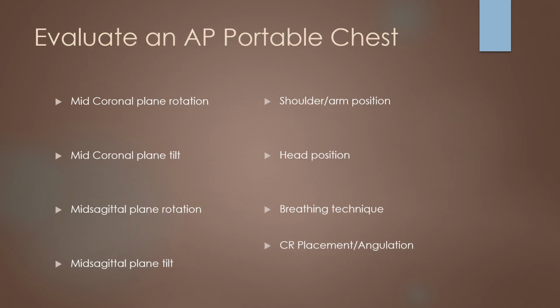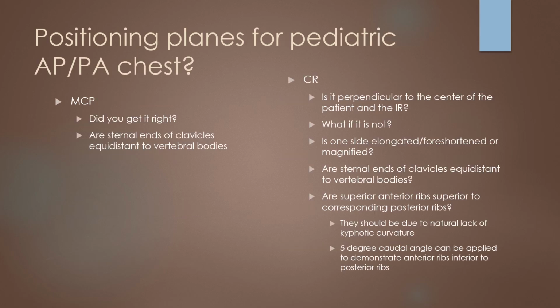So I'm going to give you a moment to predict what these evaluation criteria are going to be. Feel free to pause if I go too fast. Okay, so first thing we're going to look at is the mid-coronal plane.